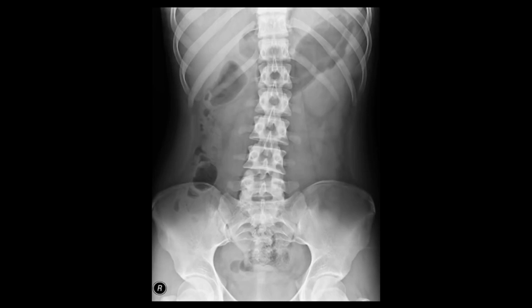This is antero-posterior view. So a plain radiograph of the abdomen is extremely valuable in excluding the biliary and renal calculi, or in case of any urgent surgery, this will be helpful in diagnosing acute intestinal obstruction, rupture of any hollow viscus in the abdomen, or paralytic ileus. It is taken after preparing the patient after giving purgatives, and the purpose of purgatives is to eliminate the excessive fecal air or gas shadows from the intestine.